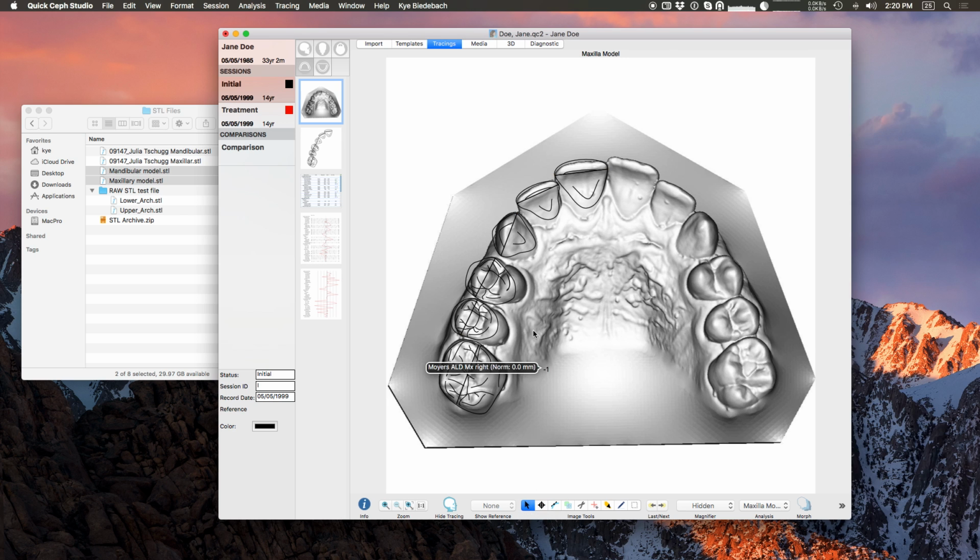So when you're done, you can see the teeth outlines show, and you can of course use the correct tool just like you're correcting a tracing. And here I'll pull this one down a bit. It should be more like that. You can see that outline fits better now.